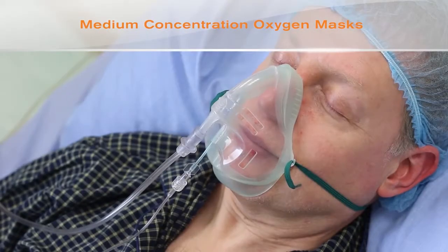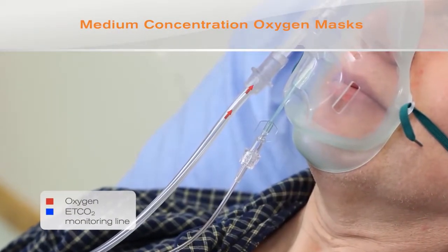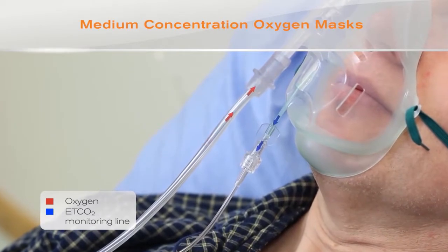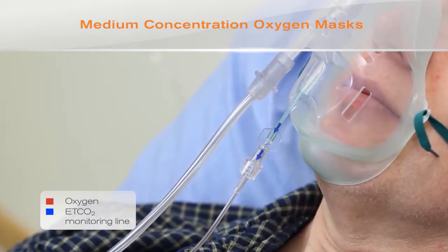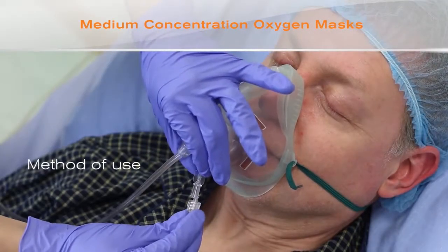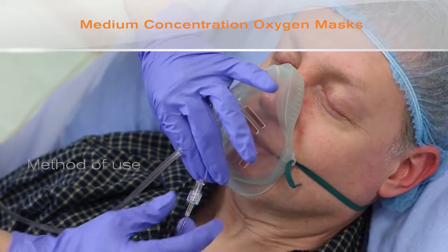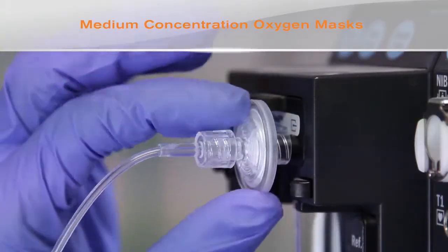Medium concentration masks, such as the Intersurgical Sentry mask, are also available which feature the ability to measure end-tidal CO2. This is beneficial for patients undergoing conscious sedation where respiratory depression should be monitored. A monitoring line can be attached to the mask with a Luer lock connector, and the other end is attached to a capnograph.